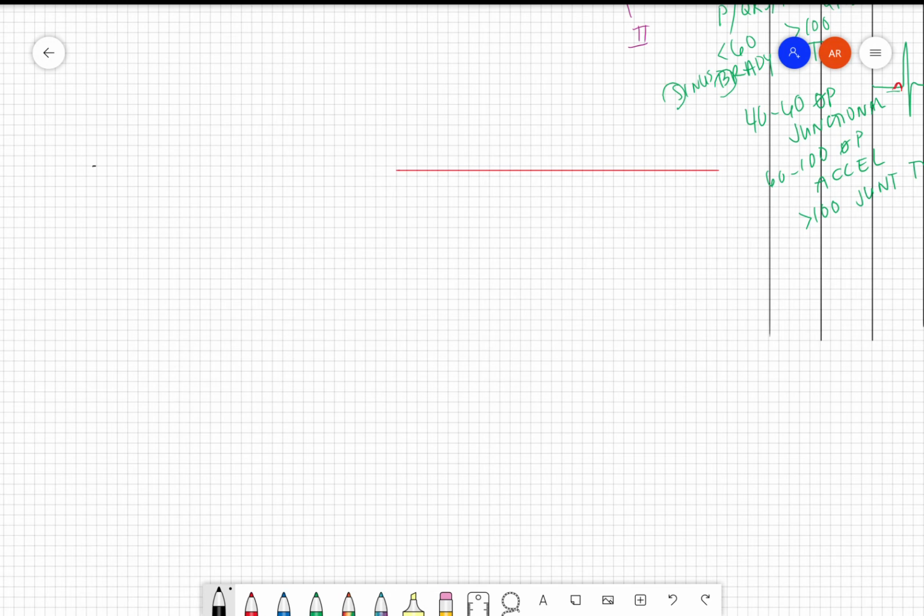Okay, so I have my P wave. My SA node has fired. It's stuck in the AV node. Then I get my QRS, the depolarization of my ventricle, then another P wave, my QRS, and my T wave. And let's say I'm chugging right along, and I get my P wave, my QRS, my T wave, and then boom, a P wave, and let's do a T wave there. And then we're going to go back. Let's see, how far is that?